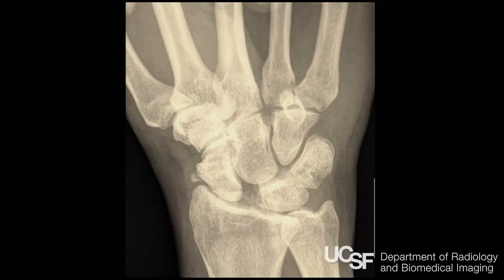There's the perilunate dislocation. The joint spaces should all be about the same. So in this case, obviously the distance between the scaphoid and lunate is much bigger than the distance between the other carpal bones in the scapholunate dissociation. Now when this occurs, the end result will be what's called a SLAC wrist, or scapholunate advanced collapse, which is radial-sided arthritis, which is why you want to treat this. You don't want this to go unnoticed. You want to prevent the arthritis that will end up being a lifelong problem if you don't treat it. There's also a little avulsion fracture off of the scaphoid fracture in this.